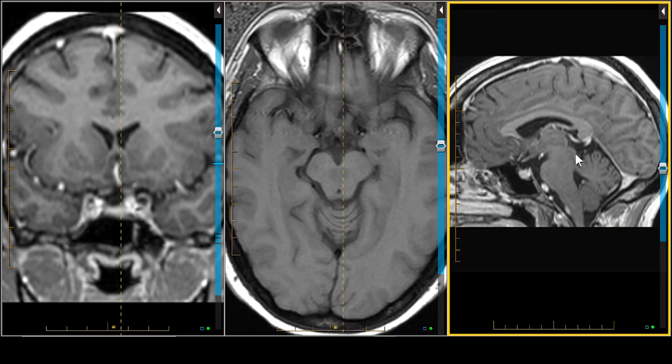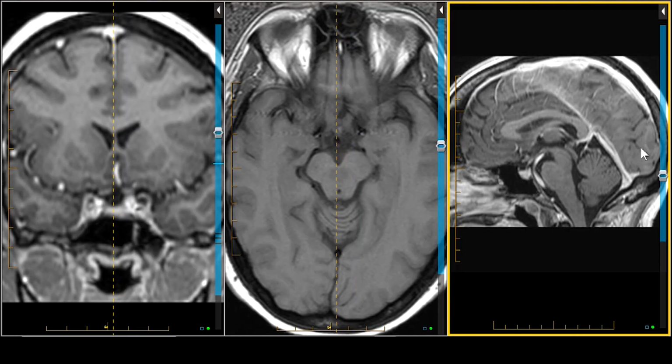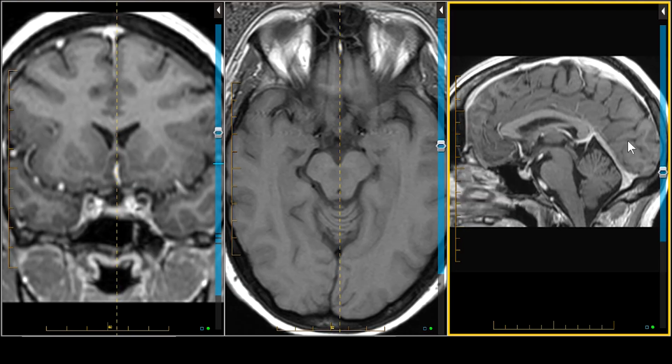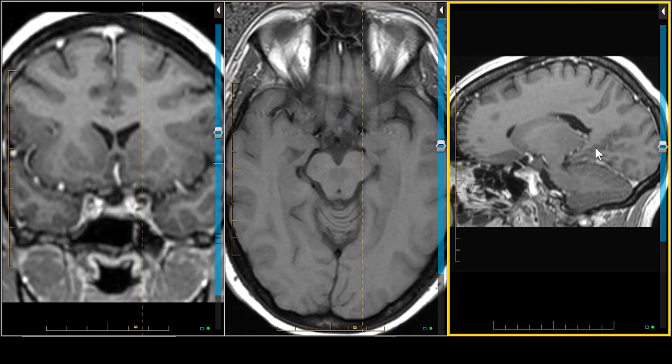If you look in the sagittal projection, it's pretty easy to identify the calcarine sulcus. It's the main sulcus right here that merges with the parieto-occipital sulcus, forming this Y, or as Tom Naidich has described it, the lazy Y that continues on anteriorly as the anterior calcarine sulcus. Right above it, you have this little beef tongue of the cingulum coming around just above it. So that's the anatomy of the visual pathway in its retrochiasmatic distribution.